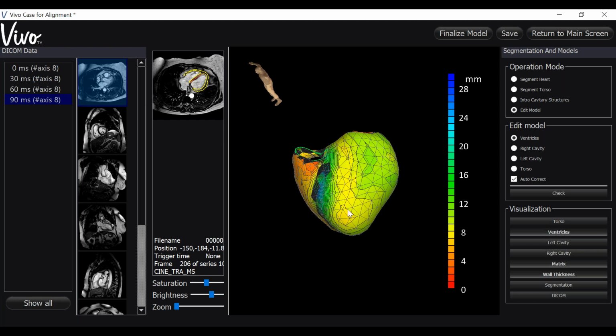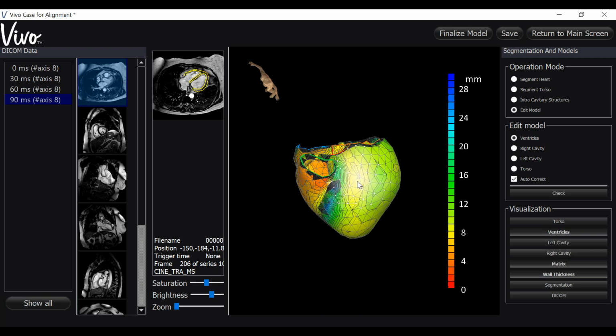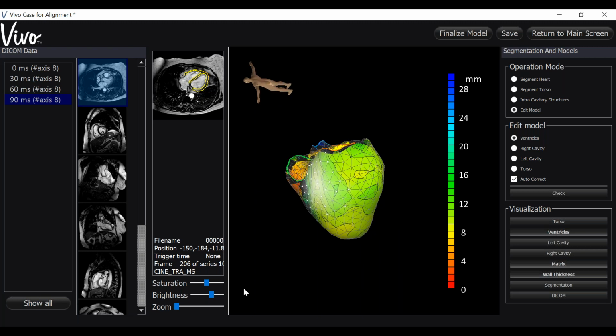So we're almost finished here. Got a little more work to do. Scroll wheel up. Scroll wheel up.